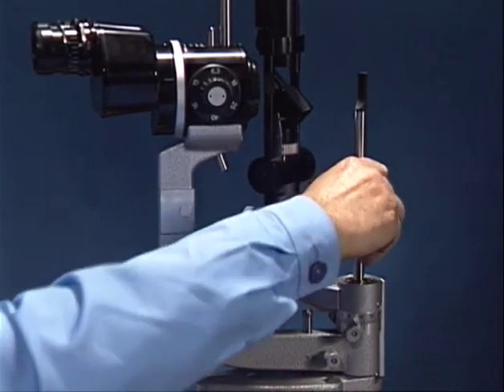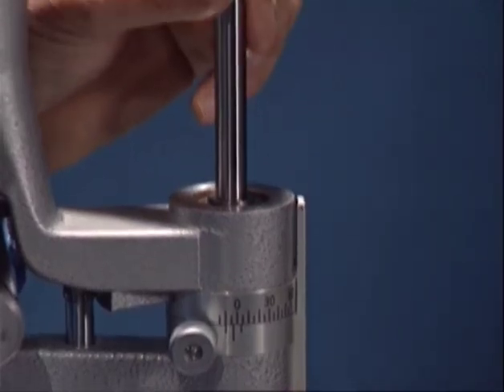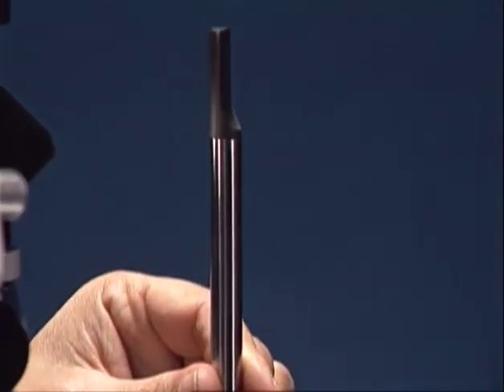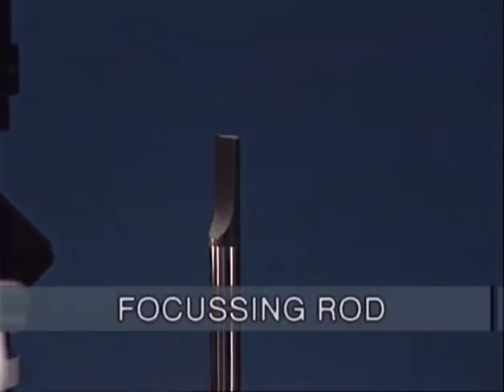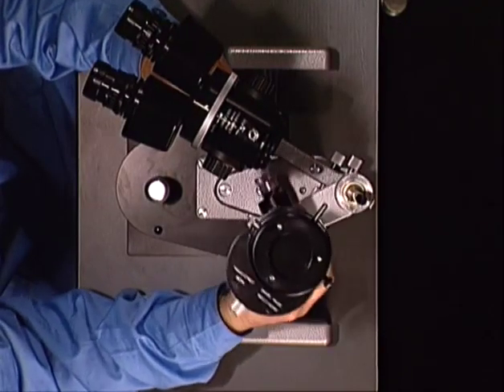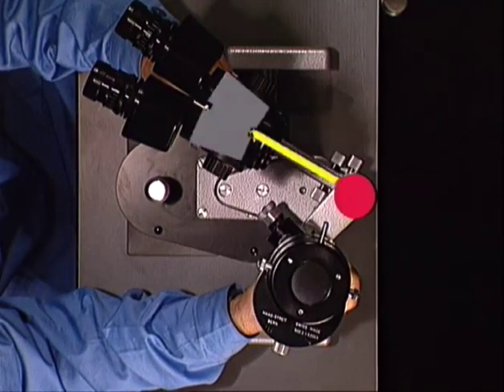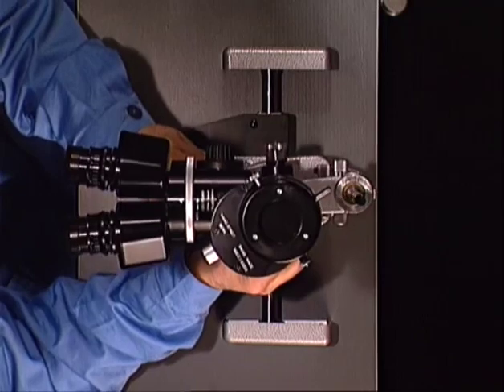The focusing rod is inserted in the rotation axis of both microscope and slit light. It is rotated until the projecting surface faces the microscope at right angles. The focus of the slit light needs not to be adjusted because it is set by the construction of the slit lamp. But the focus of the microscope must be adjusted exactly to the observer's refraction. How is this done?